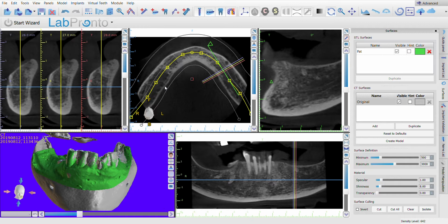So maxilla, obviously the shape of a maxilla is different, so you have to map maxilla separately. You do what you need to do, you treatment plan, you do everything that you have to do, and then you move down to the mandible, and then you map the mandible. It's just simply easier to do that and start treatment planning your patients that way. It makes it much easier.